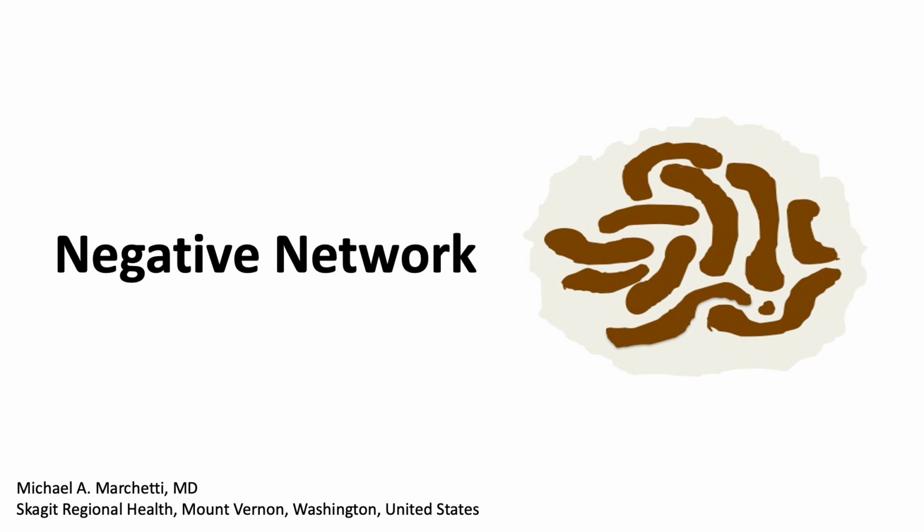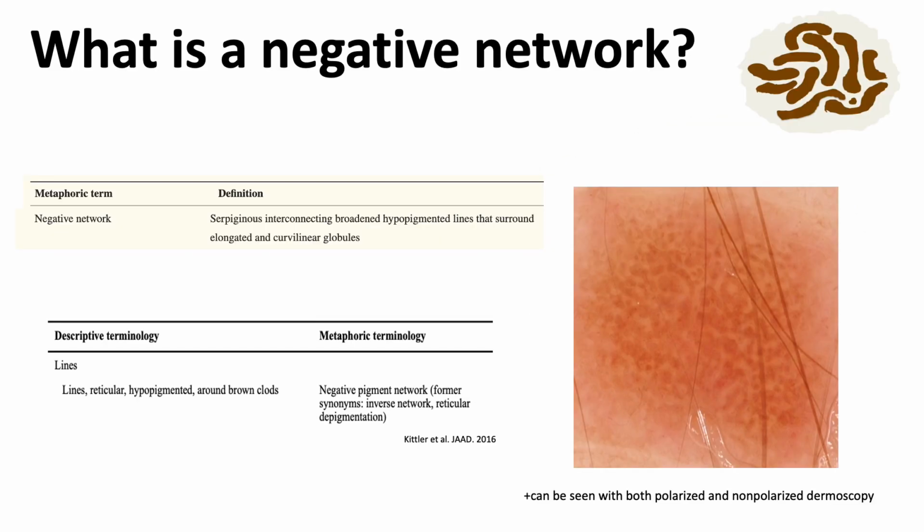I'm here to talk to you today about negative network. What is a negative network? Well, this is one of the most important dermoscopic features if you're looking to identify melanoma.